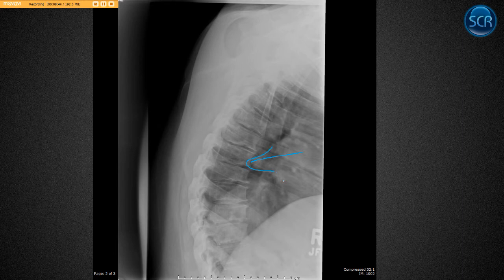No, it's a young, healthy guy. He has weak end plates, and so this is Scheuermann's disease. You got some Schmorl's nodes in here. You got some kind of wavy, irregular end plates. This is what Scheuermann's disease looks like.